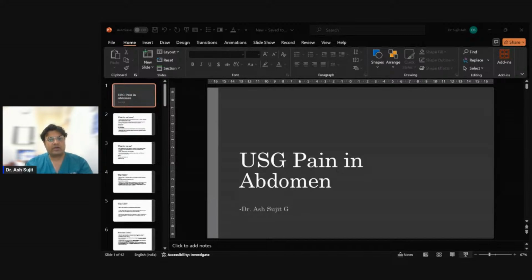So the enlarged ovary may appear relatively hypoechoic to begin with, and follicles are thought to become larger due to buildup of internal fluid, secondary to the venous and lymphatic outflow obstruction. So this is what you can see: the enlarged area or the peripherally pushed follicles, and there's complete lack of parenchymal blood flow. What you do in such cases is detwist. But a similar appearance can happen because of massive ovarian edema, which can look like a tumor enlargement and happens because of accumulation of interstitial fluid and peripheral orientation of multiple follicles. So you have to differentiate in this way.